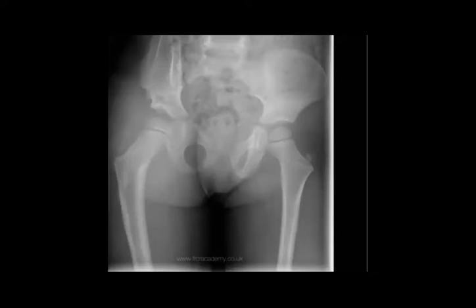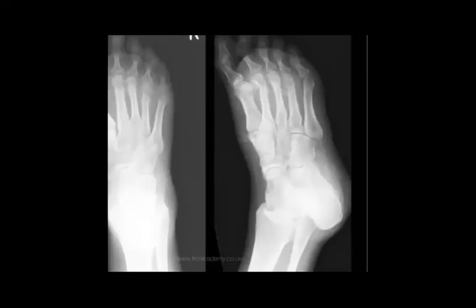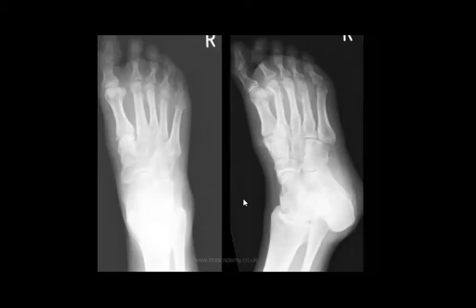So which line is disrupted here? Shenton line. Shenton line, left side or right side? Right side. So the right side is disrupted. And what else? If you try to apply the Perkin and H line, maybe it's not clear, but you can see at least the acetabulum. Are you happy with the acetabulum here? No. And the iliac bone? So this is what is called right DDH, developmental dysplasia of the hip, right side. Perfect. Again, we saw 2 cases at least today, so please try to check them.